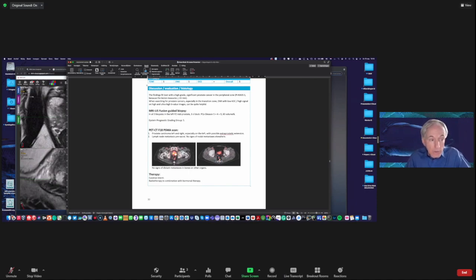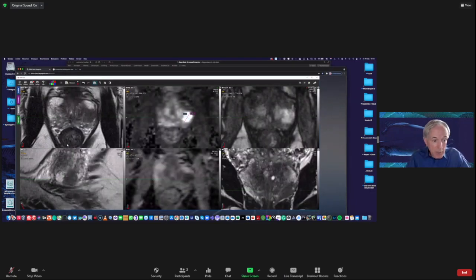Now there was something which actually in my enthusiasm I didn't look quite well. And I said that you have to look at all the images and all the prostate. If you find one lesion, you need to find perhaps another one.